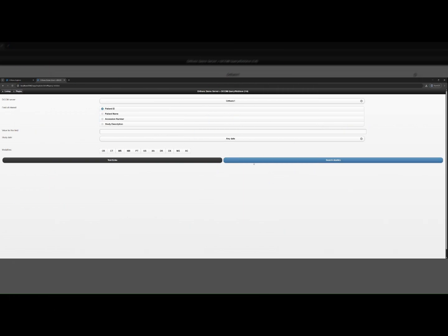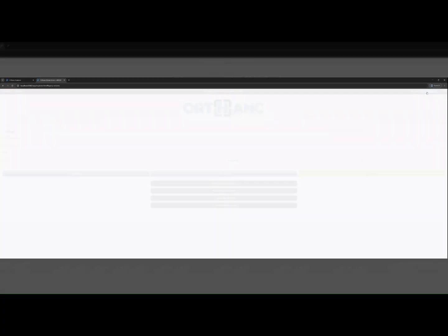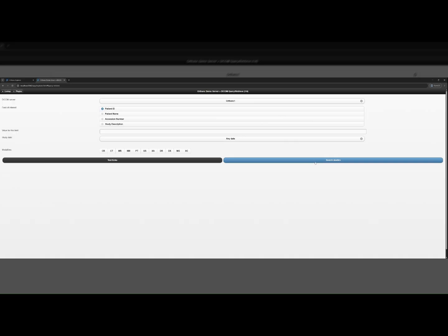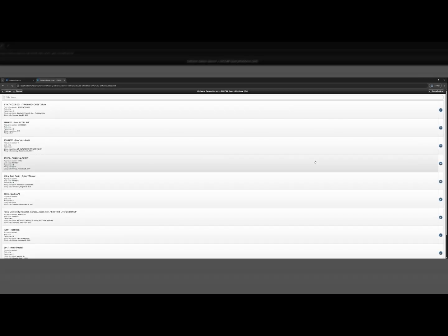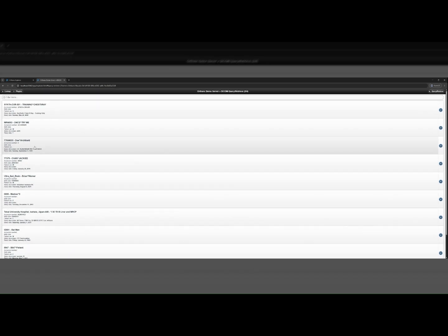Now, I just want to see what's on that remote device. So ultimately, what I'm going to do is click on search studies out here. And by doing that, you can see that now I'm doing a DICOM query retrieve to my configured destination. And these are the studies. Now, this is an important point here, not patients, but studies that exist on that remote platform.